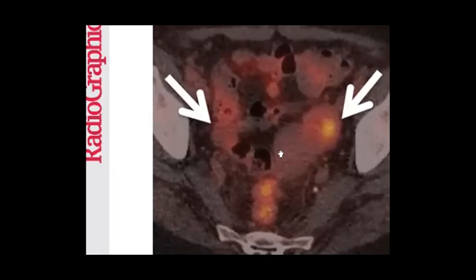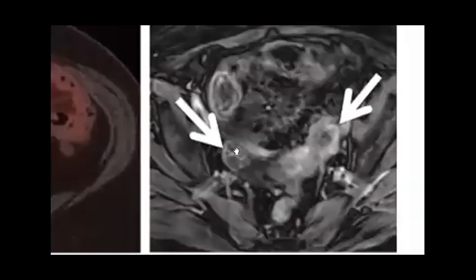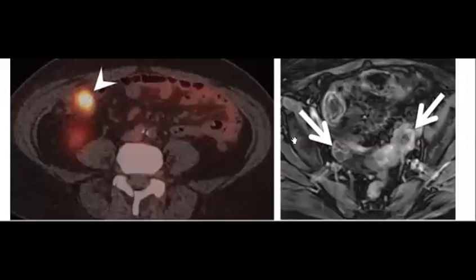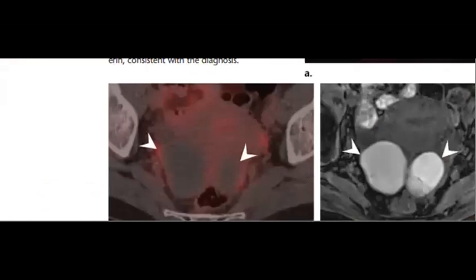Yes, bilateral ovarian lesions or masses. And again, you have other peritoneal deposits. Perfect, Ines. So Krukenberg, one of the good differentials. Yes, we mentioned this. And in MRI, you can see that this patient clearly has this. So this was a cecal tumor, GI tumor, colon cancer, with metastasis to the peritoneum. So bilateral Krukenberg, perfect. This was a nice case. Let's have another case.